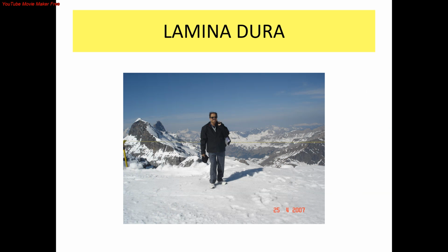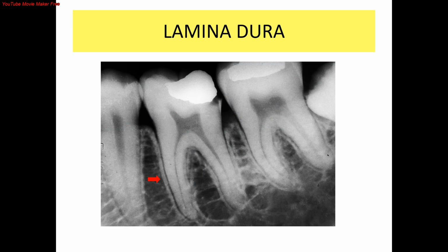Hello, I am Dr. Rajeev Gadgil, and today in this small presentation, I am going to elaborate a very important aspect of oral radiological interpretation, that is lamina dura, as seen in intraoral periapical radiograph.